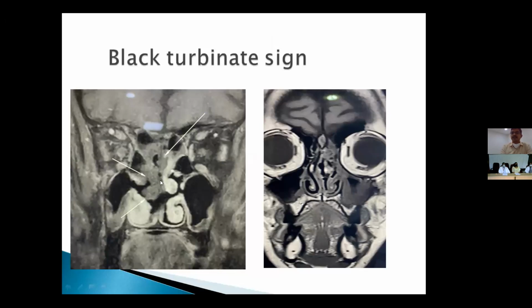Here we can see the nasal septum, which is non-enhancing. As I said before, the nasal septum and middle turbinates are the most common sites of early infection. So, a non-enhancing nasal septum along with non-enhancing right superior and middle turbinates. Compare this to the left side, where we see normally enhancing superior and middle turbinates. This is the earliest finding, and when we pick this up before it enters the orbit or spreads intracranially, mere endoscopic sinus debridement followed by antifungal administration will cure the patient rapidly.